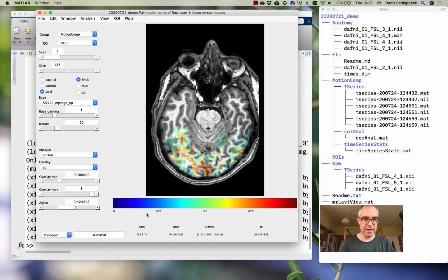So where are we in scan space, in the actual anatomical space, and so on. Okay, so here we go. Right. So I'll stop the recording here, and we'll go into a little bit more detail how we could use this information in our analysis, in scripting, and writing interrogate functions next.